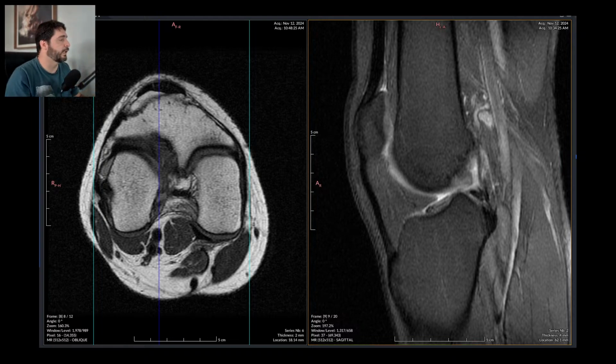So staying on my screen. Gotta clean that up. And we are done with this. This isn't an emergency scan for sure, but it was flagged as emergency, so we got it.